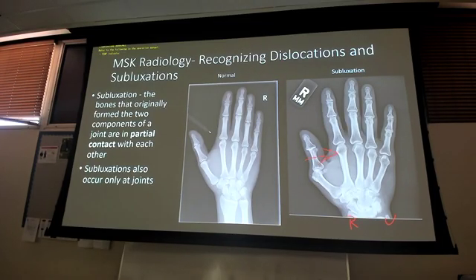I'm pretty confident it's not dislocated because I don't have almost any overlap of those bones, right? When it's dislocated, it's completely separated. Muscles and ligaments are going to contract and you're going to have kind of overlap like we saw in that knee x-ray. I don't really have a whole lot of that here. But I don't know any movement dorsally or ventrally because I don't have that lateral.